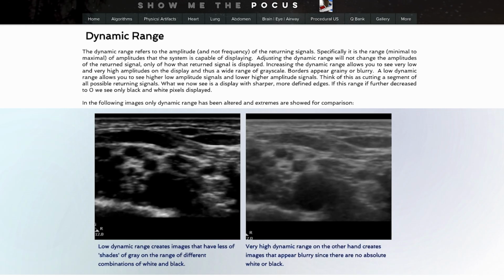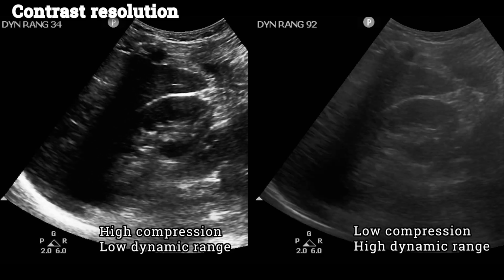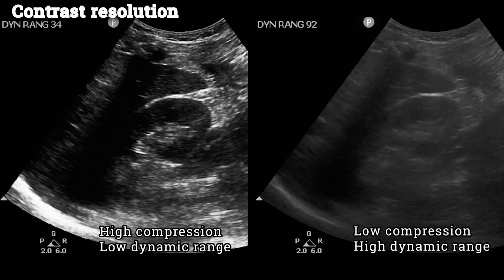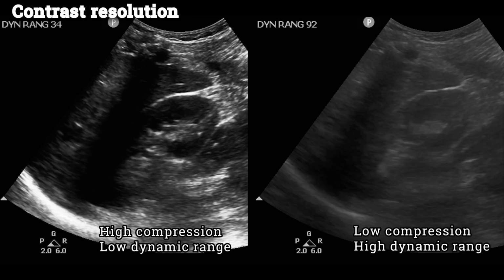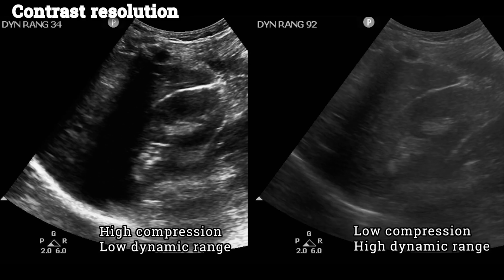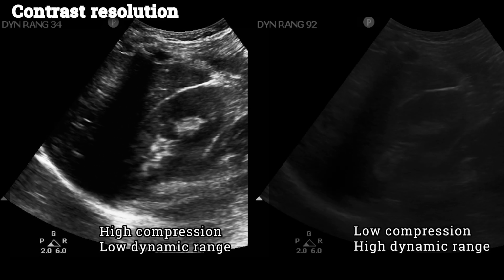The dynamic range refers to the range of amplitudes of the returning signals. The dynamic range will not change the amplitudes of the returning signal, only how the returning signal is displayed on your ultrasound display. The ultrasound machine compresses all of this information by reducing the dynamic range. We can manually change the dynamic range if we wanted to. High compression narrows the dynamic range and creates an image of high contrast. What we now see is a display with sharper, more defined edges with much higher contrast.